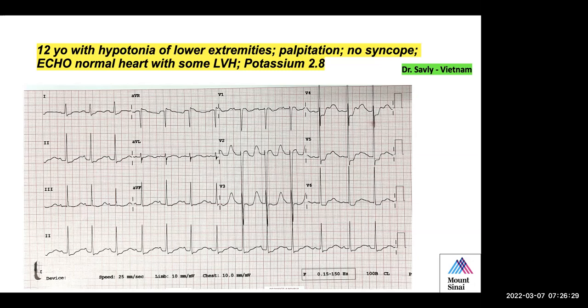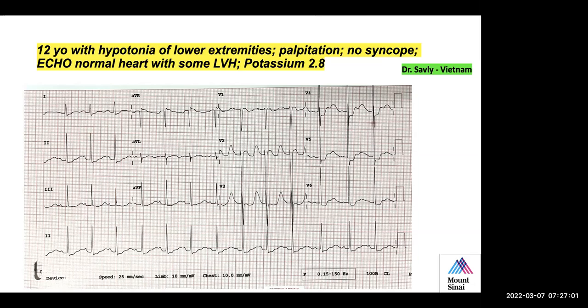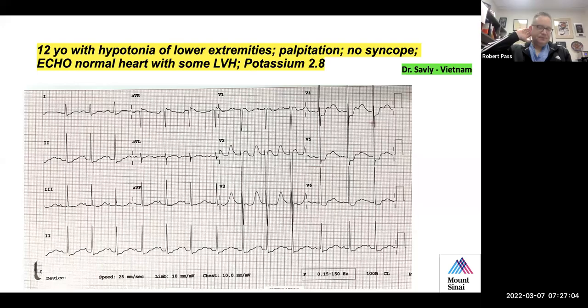The T waves are pretty flattened everywhere. In fact, they appear flat in 1, 2, 3. And then in V5, V6, they sort of appear inverted. And that could go with the strain pattern in case of an LVH. But yeah, so I would call them flattened T waves. Okay.